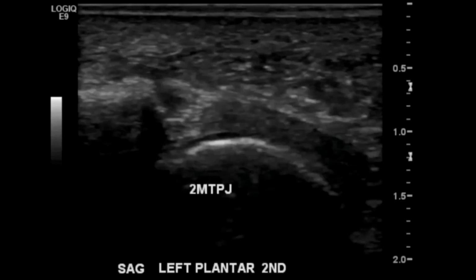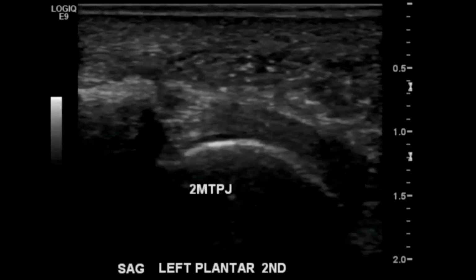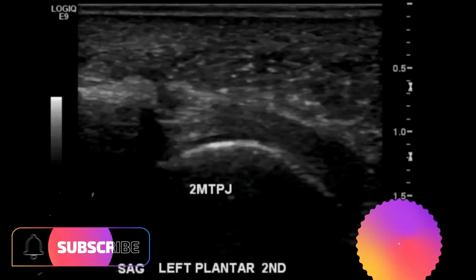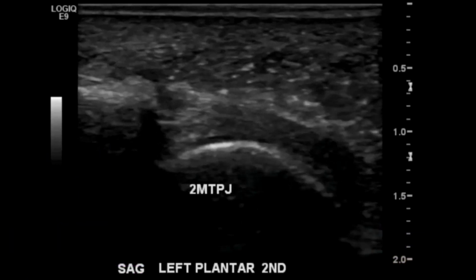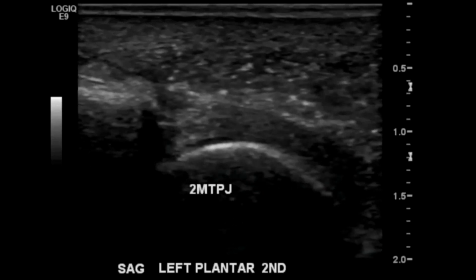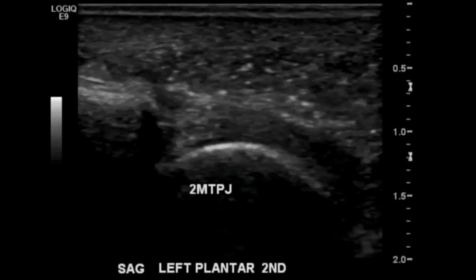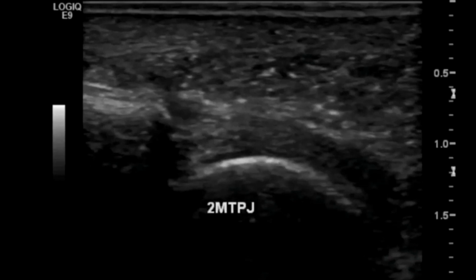The most common ultrasound appearance of a plantar plate tear will be a discrete hypoechoic defect in the plate substance. You can have thinning, flattening, and even non-visualization of the plantar plate, which may represent an extensive or chronic tear. We can see the typical secondary findings as well with pericapsular fibrosis and assess for the presence of pseudoneuromas and plantar plate distance.